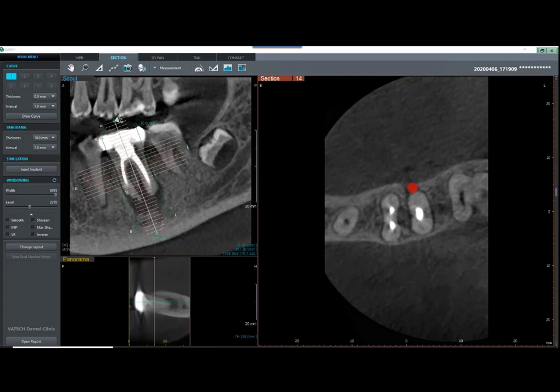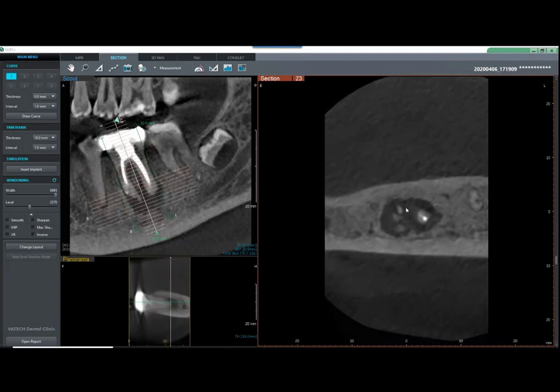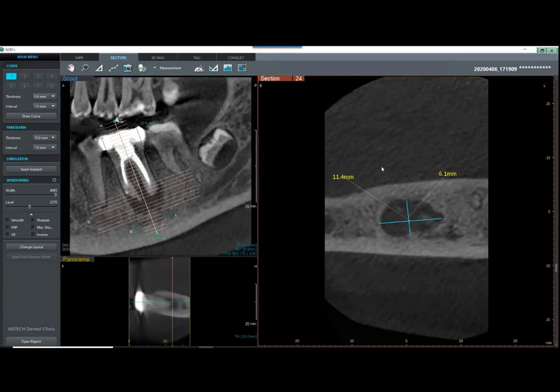We looked at this communication here, scrolling down inferior. We open up to that infection of that granuloma there. Let's go here, take a measurement, going across and through there. We can drag these out, and maybe we'll do a screenshot here. Take a full screenshot there. Talked about right clicking and deleting. Right. And clicking and deleting here.